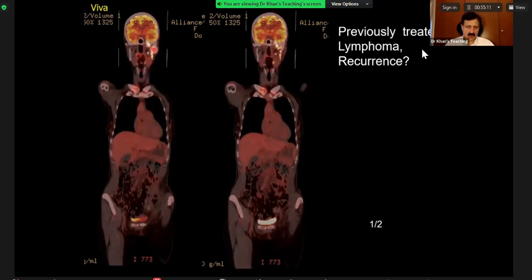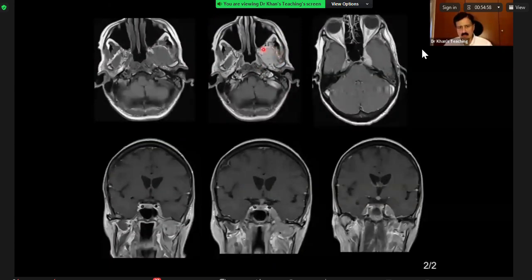So the anatomy is, if you see here, there is high uptake. There is a lymphoma here, which also goes through the skull base, and anatomy-wise, it can only go through the foramen ovale. So this enhancing tissue is recurrence of the tumor. On the next slice, it shows expansion and enhancement, and which is also seen here. So you can see that it is in continuity with this enhancing focus. And if you compare it with the right side, you can imagine that there must be some expansion of the foramen ovale.